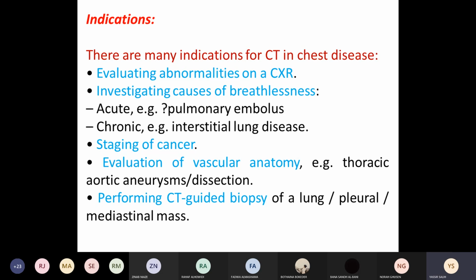We are in doubt about this lesion. Is it tumor? Is it foreign body? Is it artifact? يعني due to يعني technical causes. For this chest X-ray required, this patient required CT for more evaluation of this abnormality in chest X-ray.